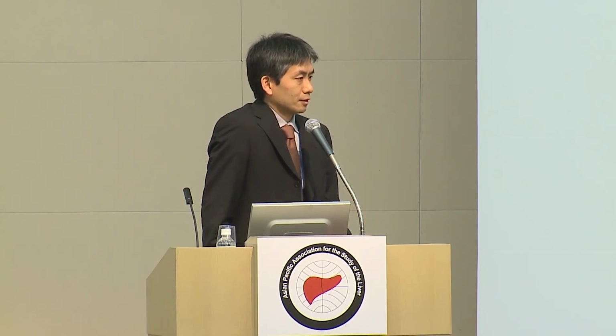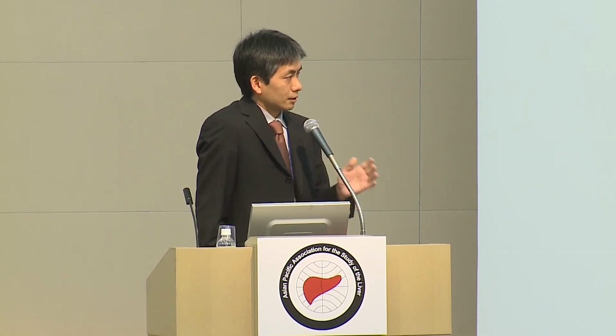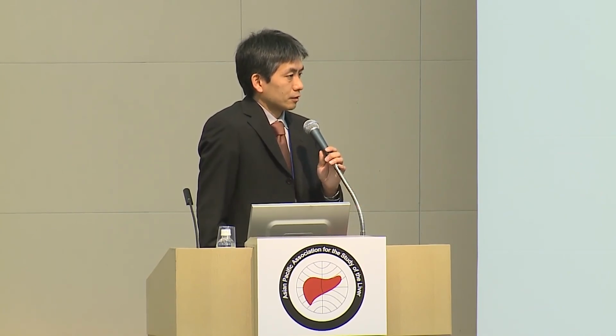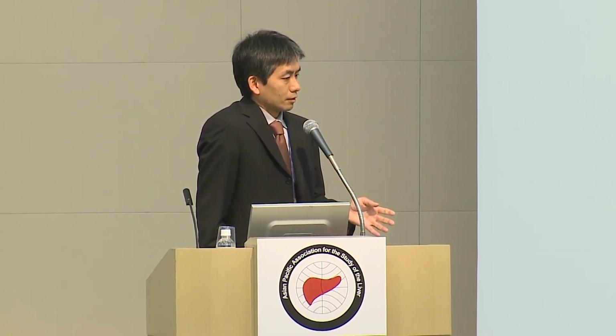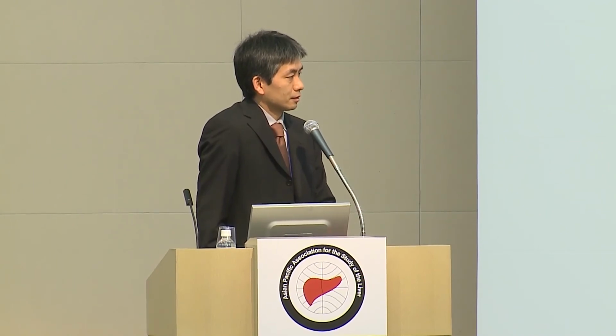I perform CEUS almost always, and after CEUS, we perform EOB MRI as first line, and CT sometimes we use for diagnosis of HCCs.